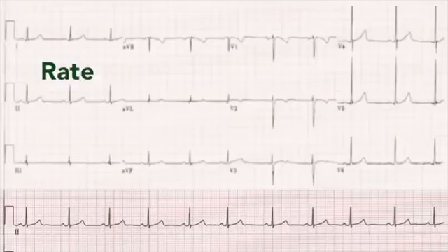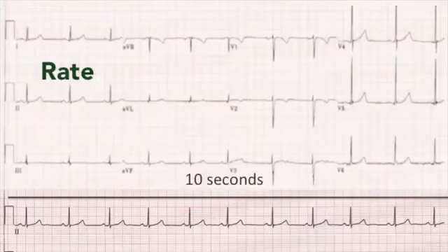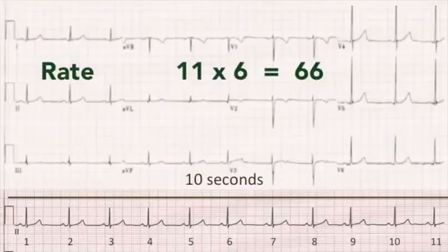If the waves are irregularly spaced, then another method works better. Here we measure a certain amount of time. Rhythm strips often last 10 seconds. We count the number of R peaks in that time and multiply up to 1 minute.